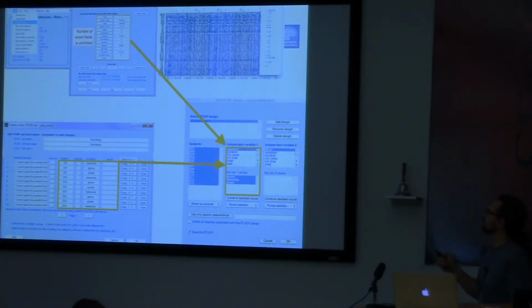But any kind of information you have at the single trial level, like the color, and you're presenting a square and you have the color of the square, you can select your condition here based on that information. It's going to look up within each of the datasets and allow you to select that. Also, that means that here we had 1 dataset per condition, so we have 1 file for ignore, 1 file for memorize, and 1 file for probe. So we have 3 types of letters.